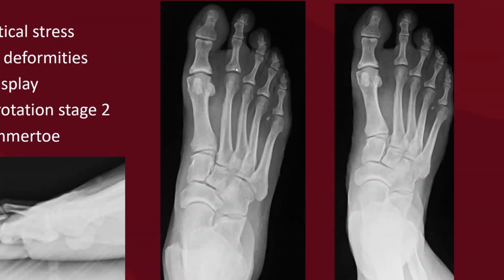So in addition, we can see in this case, there's even a subtle sclerosis seen in the proximal phalangeal bases. And how we can tell that is that in the normal state, the epiphysis is generally becoming fatty. And here we can see even the relative sclerosis to lucency, we can see there's an increased degree of sclerosis in this portion of the articulation.